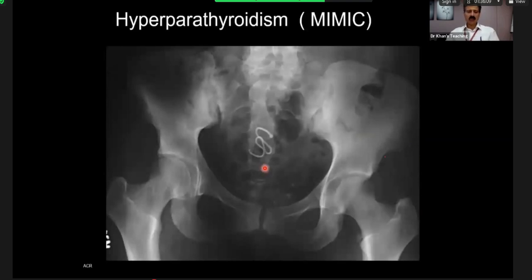This, on the other hand, is a very important exam film: hyperparathyroidism. And I'll show you better films than this on Saturday, where there will be other stigmata of hyperparathyroidism also. Now, in hyperparathyroidism, the word mimic is used because it's a radiological finding, not a pathological finding.